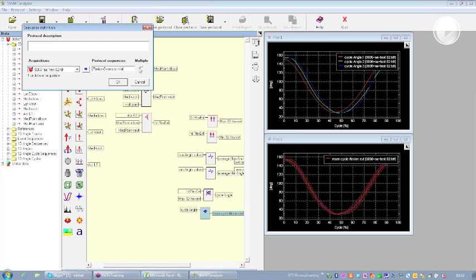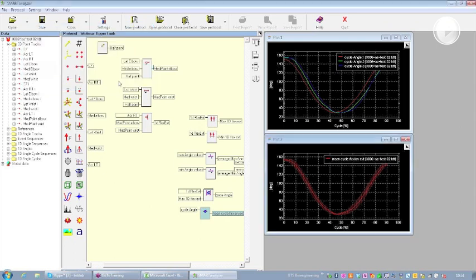trial. If I check this box here, I can tell my protocol, okay, this trial can be multiple, so everything that I do as processing can be repeated over all the trials of flexion extension you put as an input. So I type the name, if I want I select multiple, and thanks to the blue arrow in the middle I can make the association, and I click OK. So now my protocol is saved, and when I open it again, as we are going to see the next time, it's going to ask me for one or more flexion extension trials.